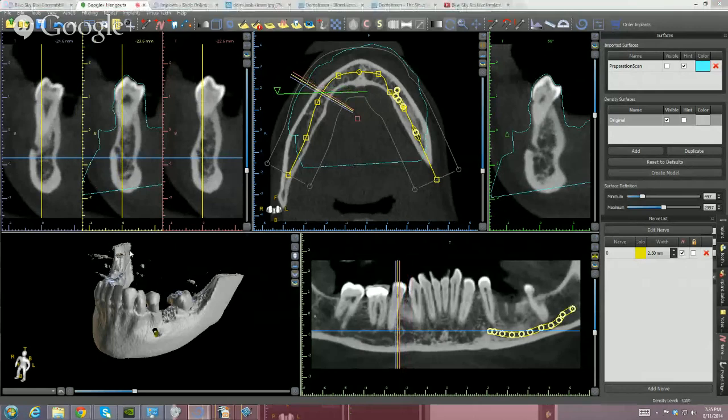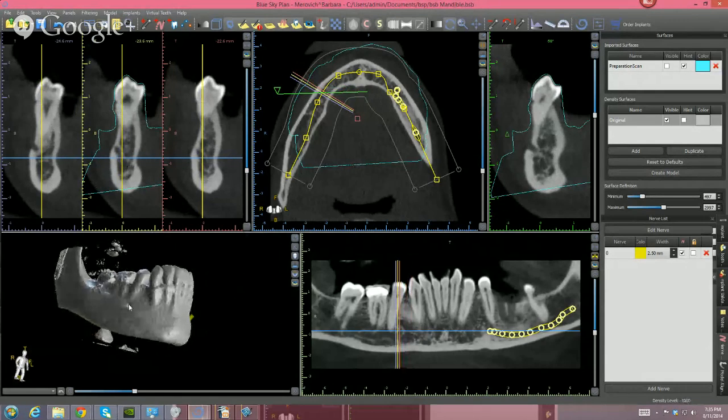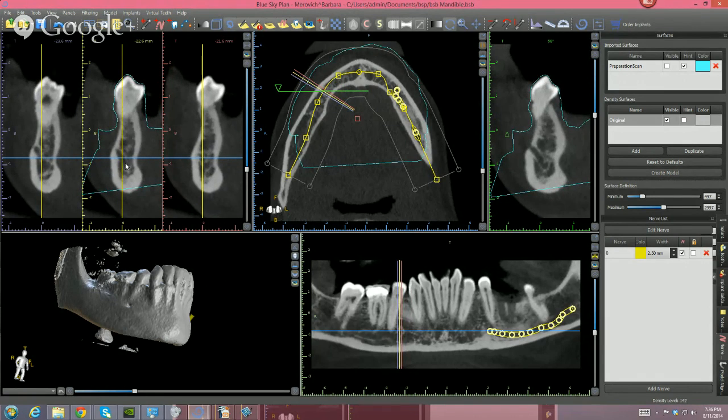If you were only looking at the exit right here of this canal, then what you're missing, I think you guys see what I'm talking about. There's a little bit of an extension of that nerve towards the mesial, towards the center. I'm going to step towards the center, and I still see nerve over here. You see it?